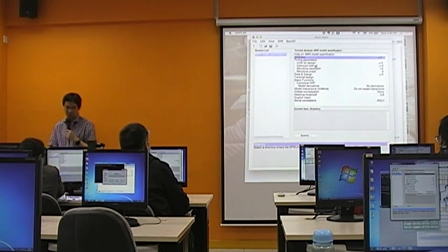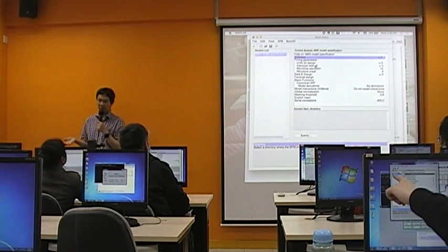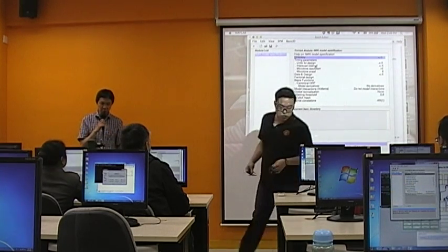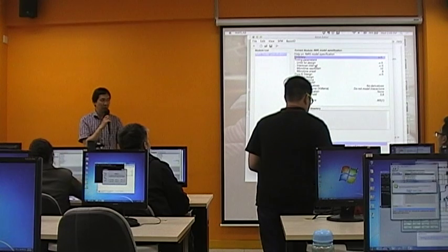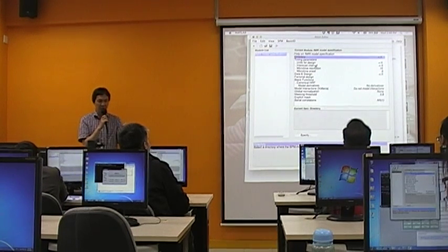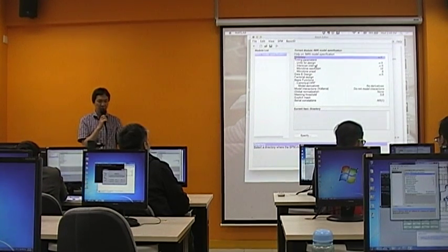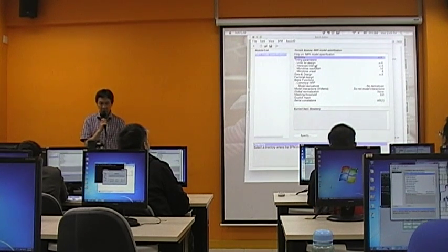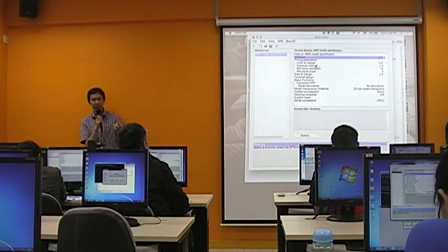This is simply for you to keep apart every single participant, because once you set up a model and then run a model, you will obtain some files.